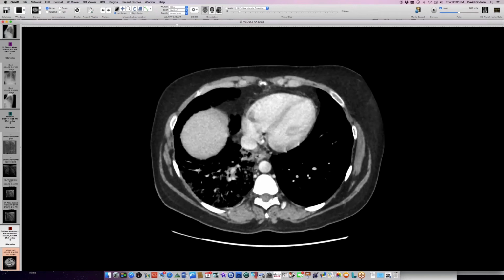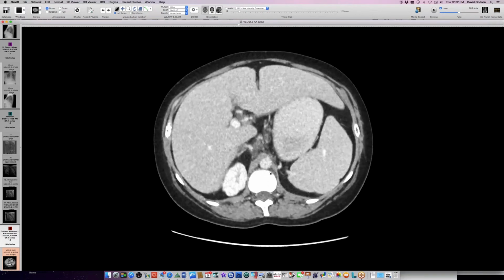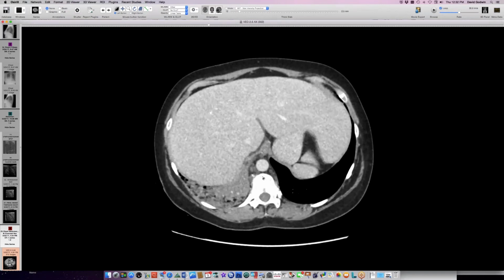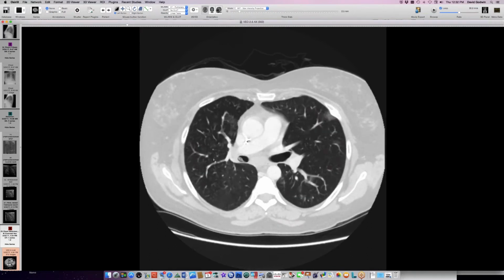You can see that there are some structures back here that could be lymphadenopathy going down into the abdomen, but these could also be lymphatics, these retromediastinal structures in the paraspinal location. So I thought this was going to be lymphoma. There were biopsies and there was no lymphadenopathy. There was nothing wrong on their node sampling. So this is not lymphoma, and this ultimately is considered an idiopathic plastic bronchitis.